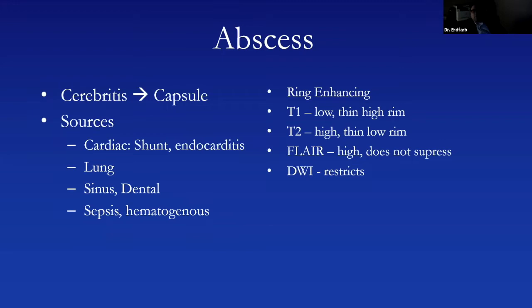From an imaging perspective, again, this just lists it. We talked about it in the pictures. It's ring enhancing, and it has edema around it. And of course, it's not simple fluid. And again, the slam dunk a lot of times is the restricted diffusion.